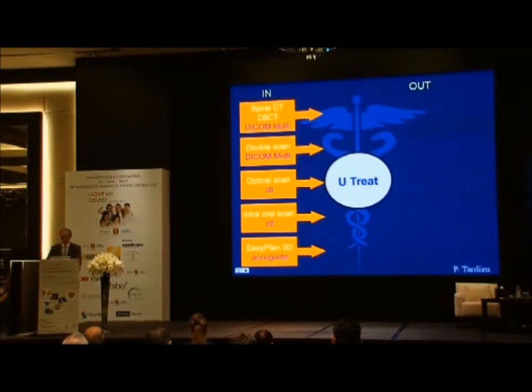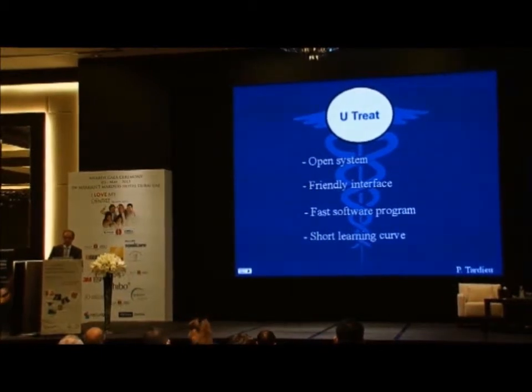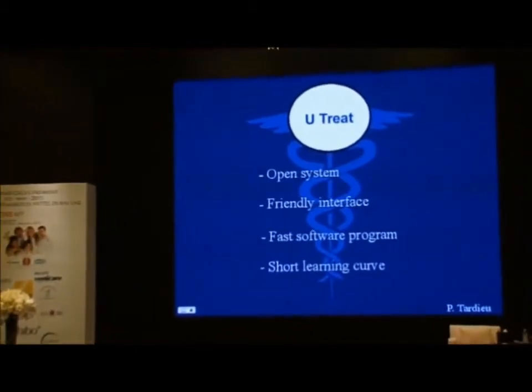This is U-Treat. Let me show you how it looks like. It's an open system, as you understand. The interface is very friendly, and I get that from people who are using that. They all say it's very easy to use. Yes, because we've been making a real effort to go up to this level. It's very fast, and the learning curve is very short.